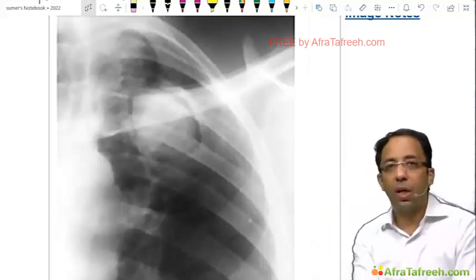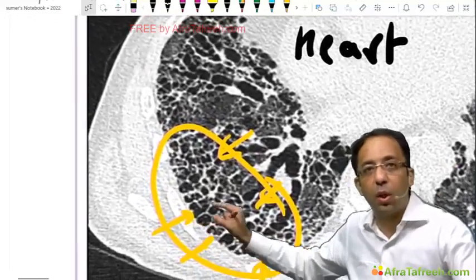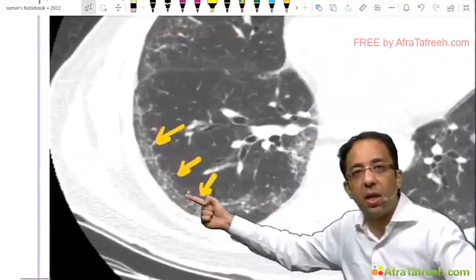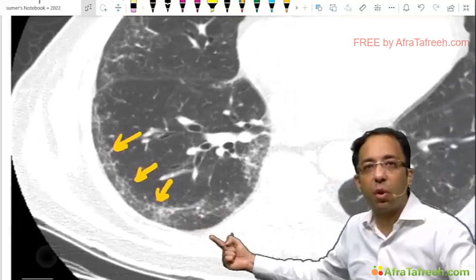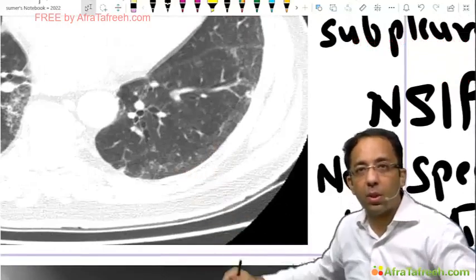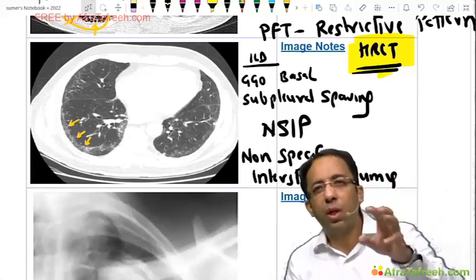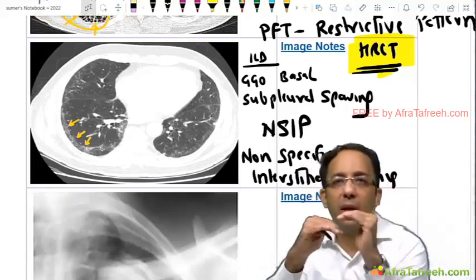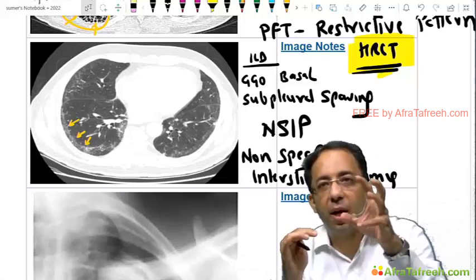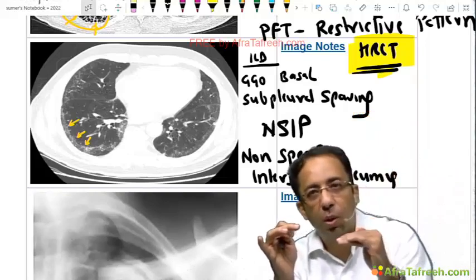Okay. Now, honeycombing is different, son. Look at this one, this is honeycombing. You see round structures sitting one on top of the other. This is honeycombing. Ground glass opacity is just a haziness. Here also you will see a slight haze, ground glass. Now what is ground glass, Santanu? Let me explain, I'll explain it with COVID again. Ground glass opacity means there is slight haziness in the lung parenchyma, but you can still appreciate the lung architecture. It is not as white as pneumonia would be, right. Pneumonia is completely white, this will be less white.